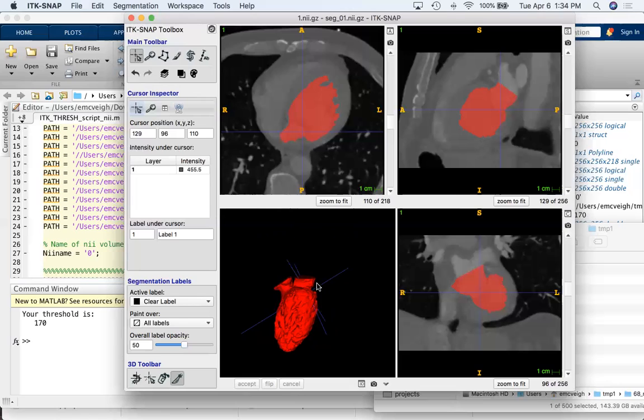Oh, well, the way that works is you draw a plane. The stuff that gets removed is the stuff that's on the arrow side. So if the arrow is going the wrong way, you hit cancel and you draw the opposite direction. And then it goes this way. I see. So if I want to reverse my arrow, I just hit cancel and draw the other way.